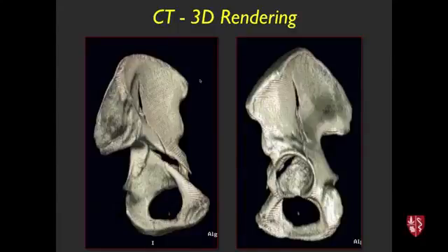In orthopedics, we use that for practical things like pelvic fractures. The orthopedic trauma surgeons like us to generate these types of images where we disarticulate the pelvis electronically and then can show fractures from the inside perspective of the pelvis and then from the outside perspective. So here's the acetabulum, with a fracture going through it. And that helps them think through how they might repair this, put plates on it, reduce the fracture fragments.